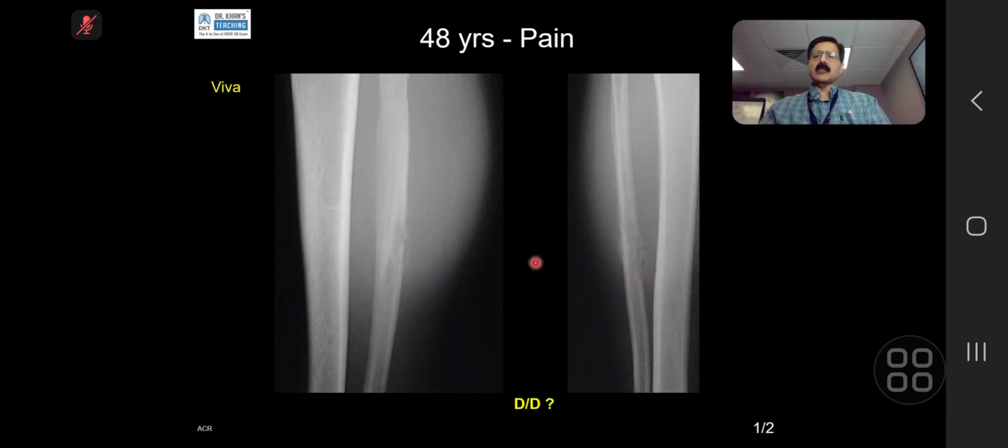So the main point is that this is an aggressive lesion. It is not lytic. It is destructive. You don't see a lucency. I'm just debating that term, lytic lesion, you said. Okay, sir. Don't think that in all aggressive lesions you will see a lucency. Don't think that. That is why I'm elaborating on this. If you look in detail, this cortex is destroyed. This cortex is destroyed. There is a periosteal reaction. And other than that, soft tissue component, you did well if there might be something.